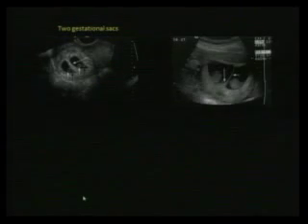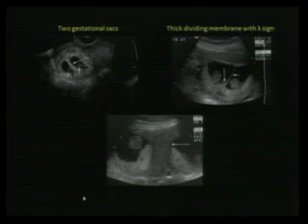So here's an example here. We have two gestational sacs, thick membrane in between them. Again, two gestational sacs. This is that lambda sign. This is what they call the twin peak sign, and there's that membrane going between them. Another example here. Here's a really thick membrane between these two twins. Here's one placenta. Here's the other placenta. Again, two separate gestational sacs.